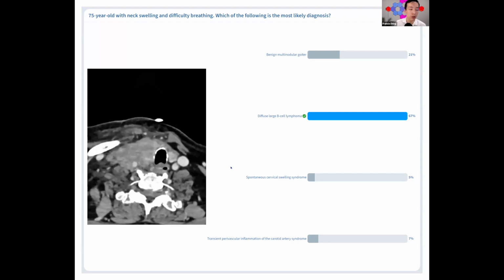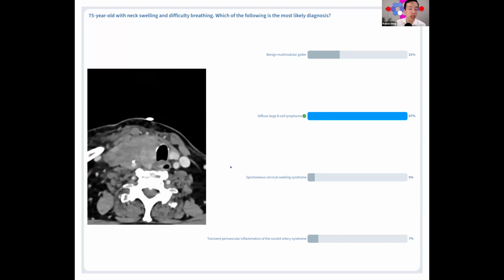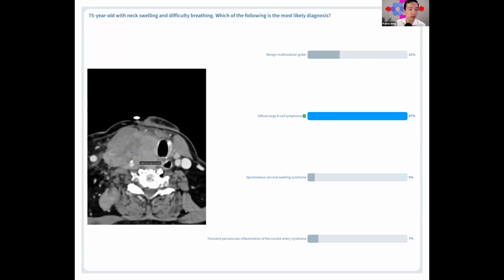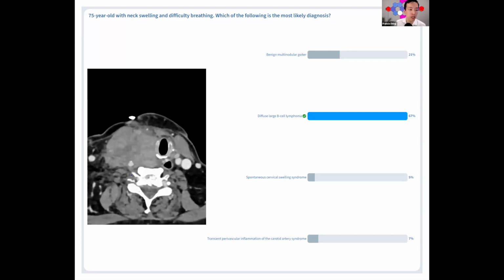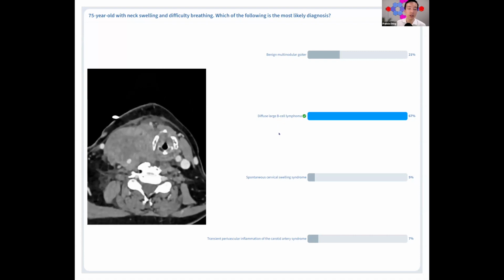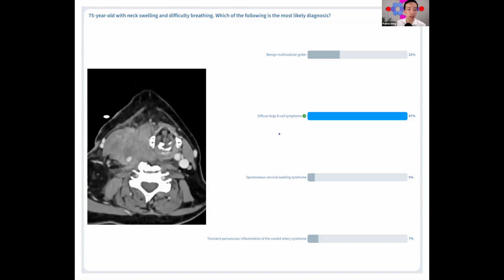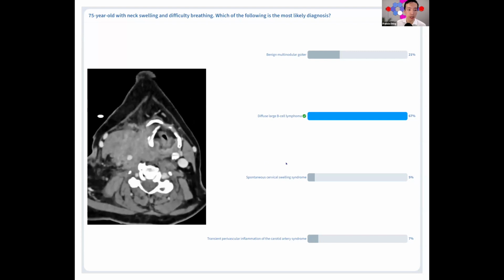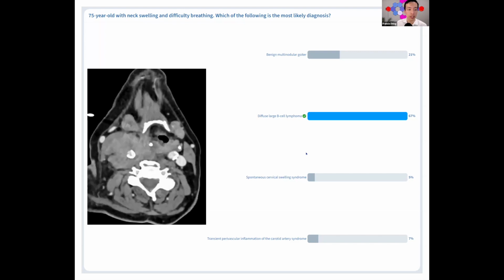It would be larger than a normal thyroid, but it would still contain some of the shape characteristics of a thyroid, whereas this is a unilateral, low-enhancement abnormality with infiltrative borders into the lateral neck, and that would be suspicious for malignancy. The things I would consider on the differential include lymphoma, as well as anaplastic thyroid carcinoma, and other malignancies with regional metastatic spread, such as from the airway or the larynx. But we didn't see any of that.